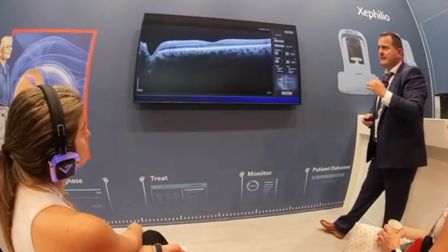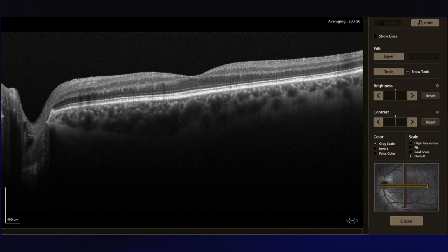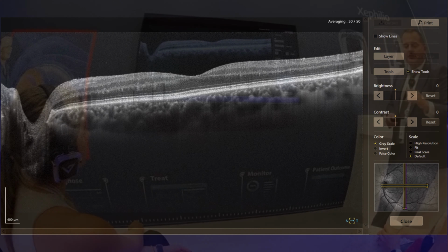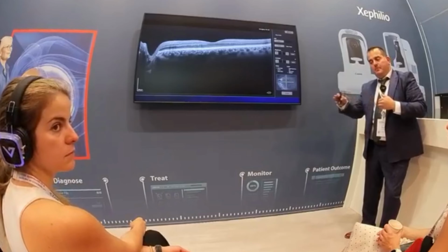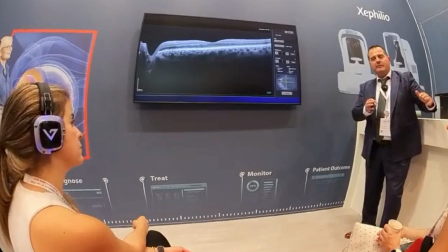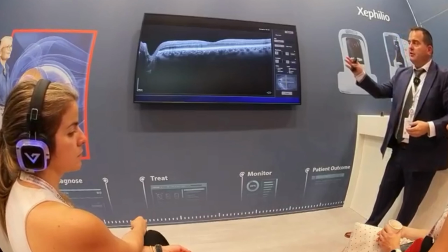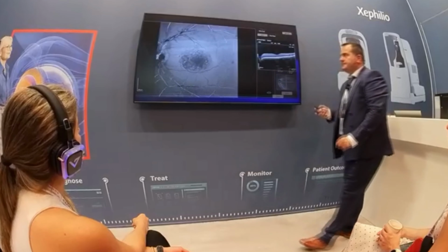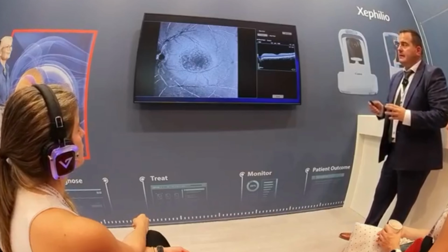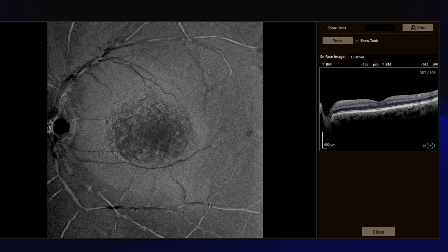And also I want to emphasize the choroidal imaging. This is a system which utilizes, if I'm not mistaken, an 890 nanometer light source, which has more depth penetration compared to the classic 780 nanometer OCT systems that were available up to now. So we have good choroidal imaging here, up to the sclera actually. So again, these are ischemic problems, in the border of the outer nuclear and outer plexiform area.